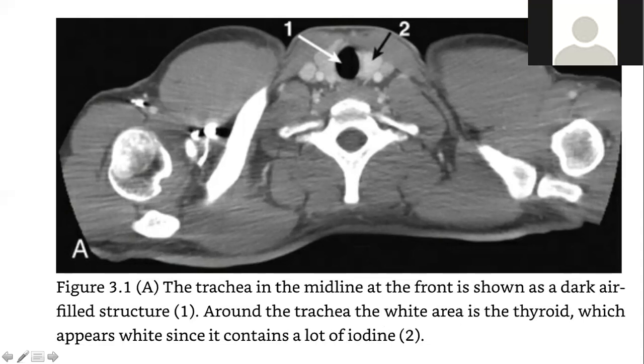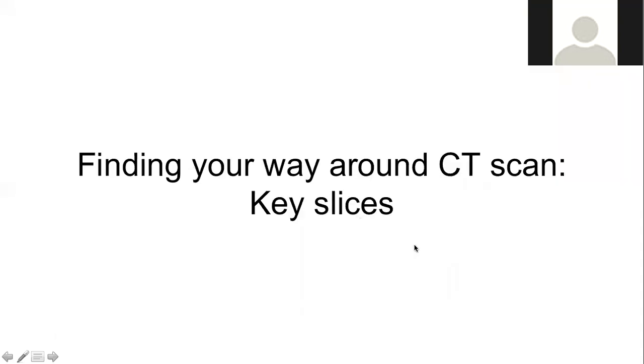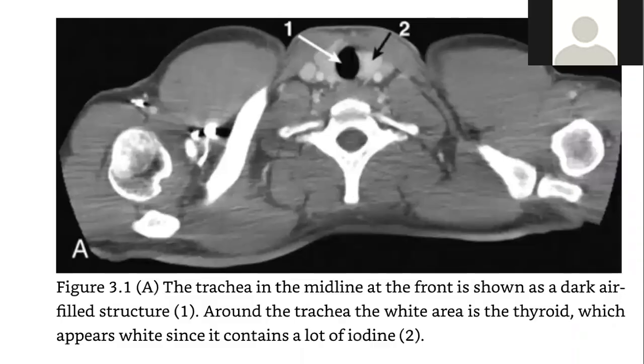Yeah, so they throw a lot of CT slides on there, right? All you have to know is I gave you 5 or 6 key slices. If you know these 6 slices cold, you'll be good with CT. You'll be able to recognize anything above and below that. You've got to know these few slices clean, because they'll guide you around any other slices. In this one, this is almost your shoulder level, because I can see the humerus right here.